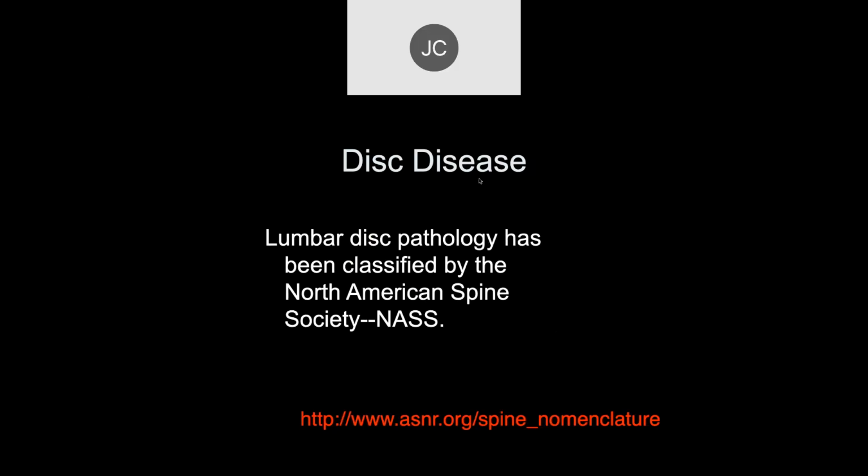So let's go on and talk basically about imaging of disc disease. This is from the previous ASNR website, but it's really nomenclature that a number of different societies came up with, who met under the auspices of the North American Spine Society to develop a nomenclature for disc disease.